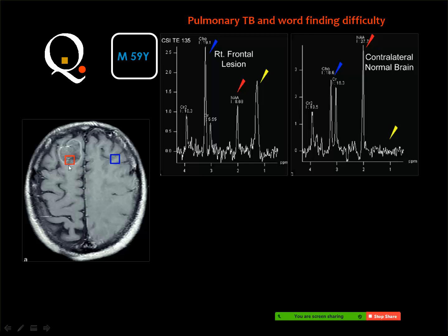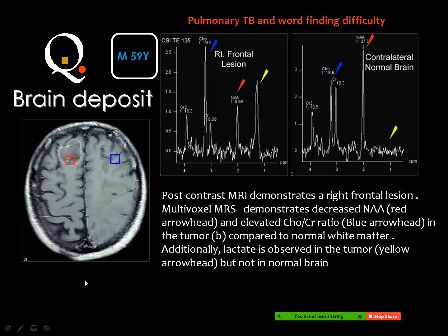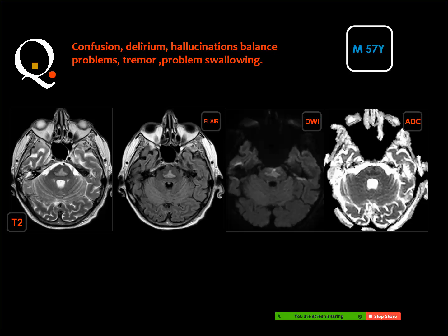If you see brain diffuse enhancement and this is a tumor, what do you think? Metastatic. Yes, metastatic or glioblastoma multiforme. They both can present with the same appearance. Then one of the good policies is to go first and look for the choline peak. If the choline peak is not present, think of other diagnoses rather than a neoplastic etiology. I will show you some examples concerning spectroscopy during this session.